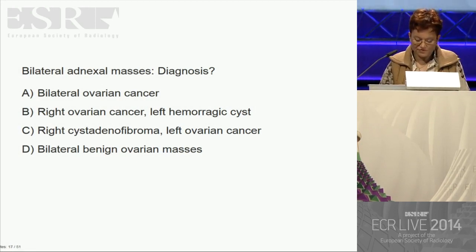So this is the right ovary, and this is the left ovary. Left ovary. So the masses on the left we are talking about are very small, bigger on the right.